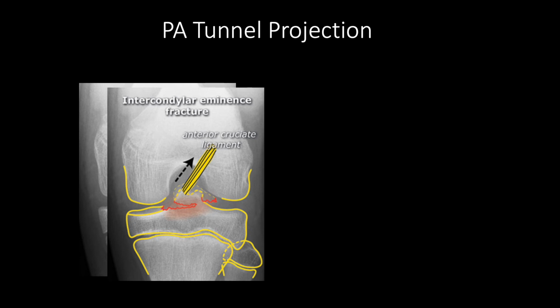So you can see in this case you got a growth plate here with the tibial plateau, tibia, you got the fibular head, then you got your tibial spine here, and you know the anterior cruciate ligament is going to be attaching into the tibial spine here. So you can see if there's a fracture, occasionally you get an avulsion where the ACL pulls the bone off of the tibia here rather than rupturing the ligament. So you're always looking for those type of things, and also osteochondral defects due to ACL injuries.